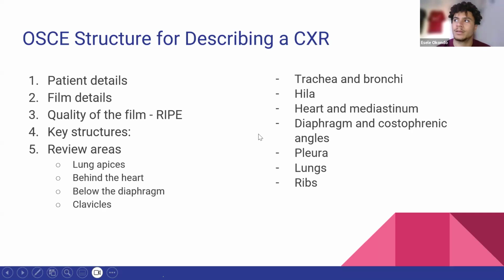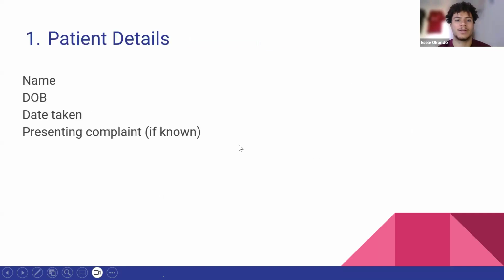To look for pneumoperitoneum, you can look for pleural effusion, you can look for signs of a pneumonia because you just have blunting of the costophrenic angles there on the diaphragm. And behind the heart, sometimes you can get cancers which hide here behind the heart. And as well the clavicles, which are important for your technical aspects, but also to see any signs of breaks or anything like that on a clavicle level.